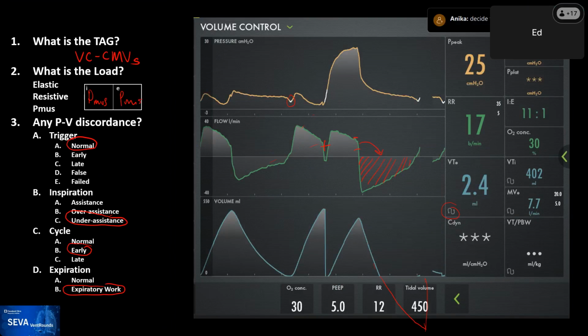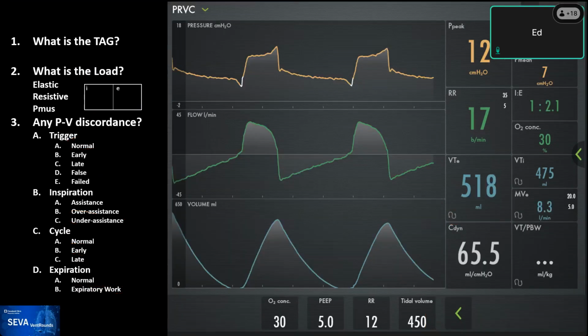Yeah, good job, Annika. This was a trick question, but you fell for it. I mean, you answered it correctly. The answer is, what's your goal? Excellent, Ariel. That's perfect. That's the first thing that you think, because if your goal is going to move towards safety, then this patient's respiratory drive is very high and needs either sedation, paralysis, pain control, bicarbonate, dialysis. I mean, you choose. And if the goal of this patient is comfort, then it would change and you may use a different mode. So in this case, the clinicians at that time decided to change the patient and they changed him to this mode.